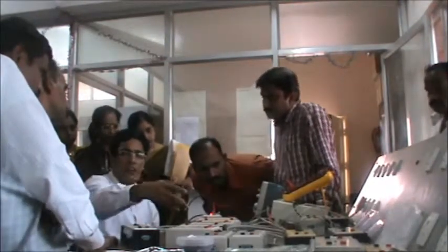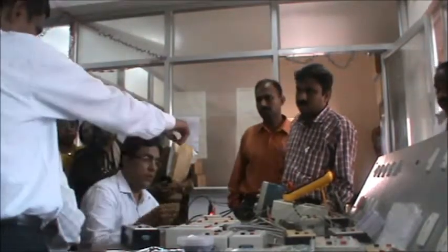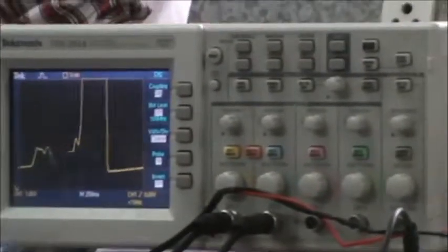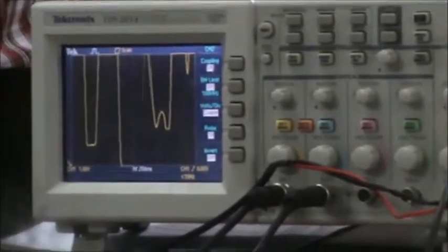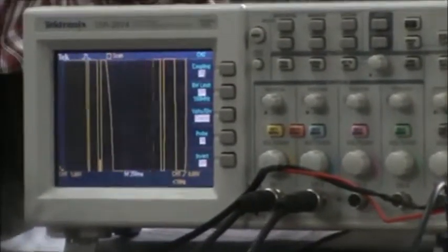Full pulse. You can do any other signal conditioning just like how we did before. Just like how we measured the dicrotic notch. That is the dicrotic notch. Normally we have a clip, and then according to the pressure it holds. Now I don't have that right now. This is the basic peripheral pulse.